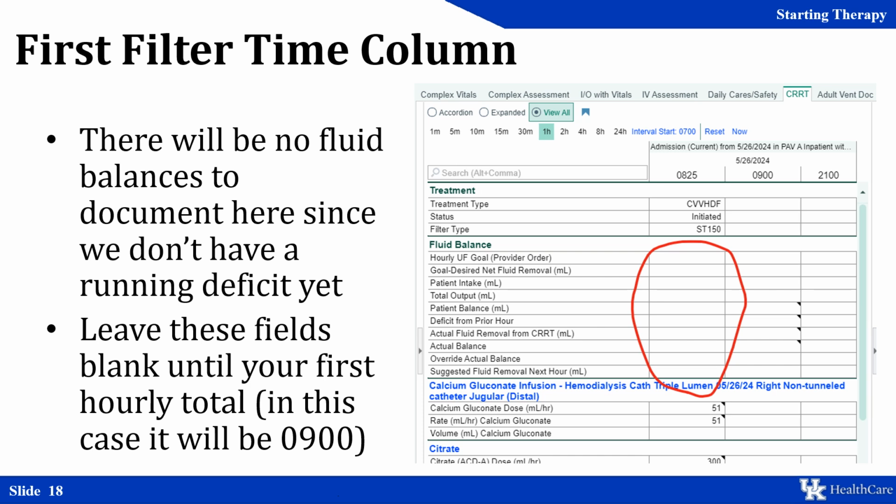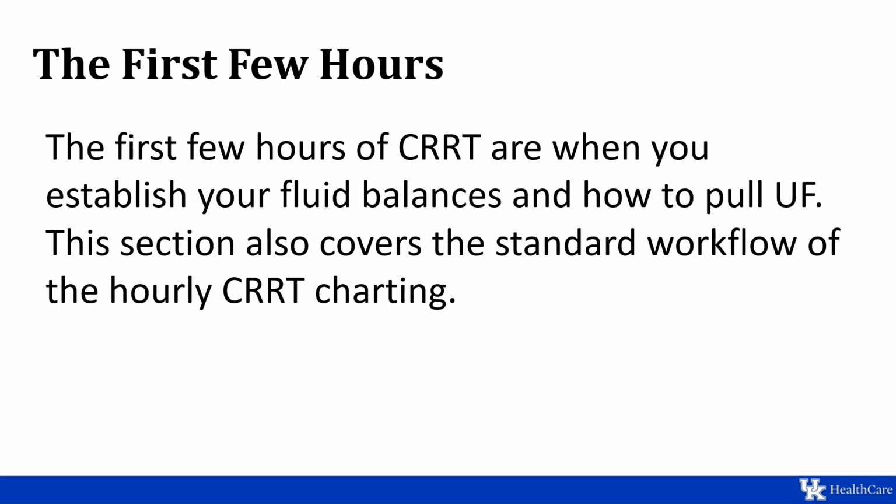For that first initiation time column, there will be no fluid balances because at this point we haven't done anything yet. This is time 0, so leave this field blank. Alright, so let's do the first few hours of CRRT now that we've started.